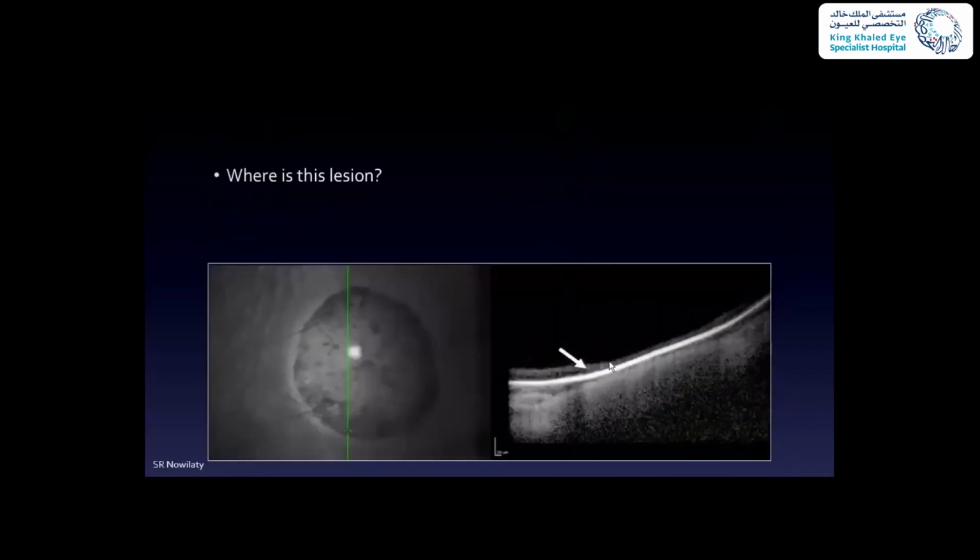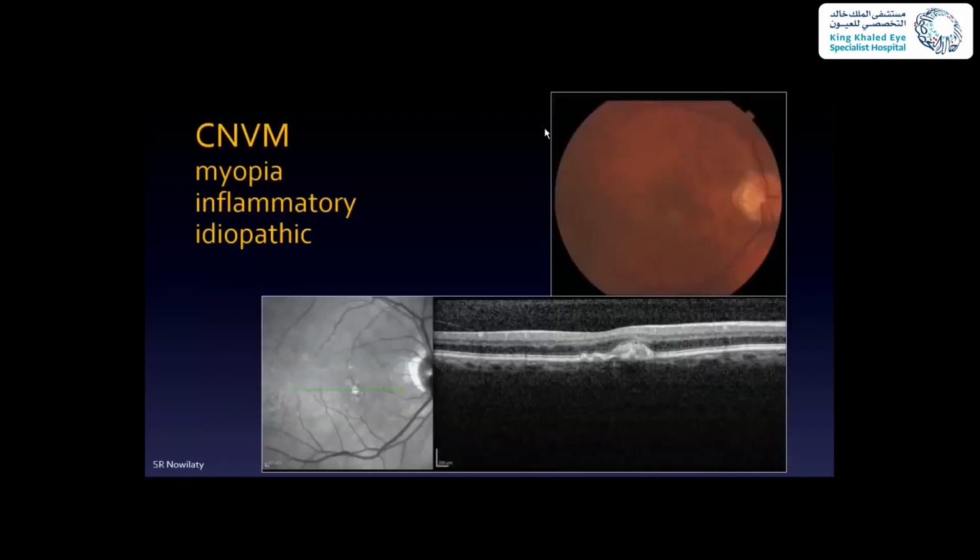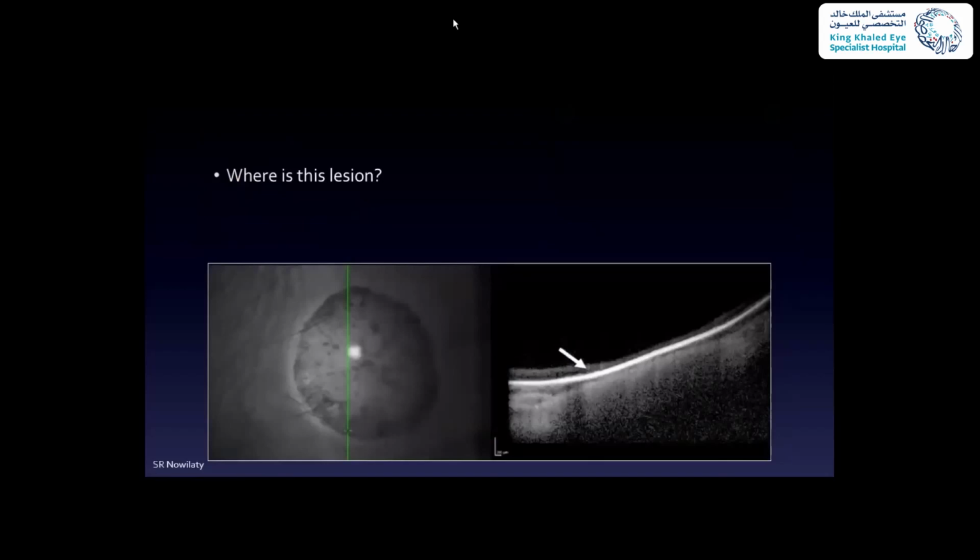Now, can anybody tell me what this lesion is? This is a deep lesion. What is this lesion? What do you notice? I'm giving you the picture and I'm giving you the OCT. Does anybody know what this is?